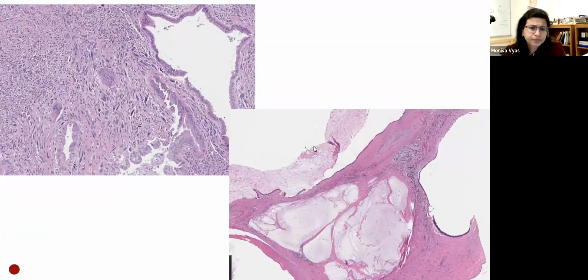And here's a histologic example of the same case which we saw on biopsy before. So this is a ductal adenocarcinoma with a component of undifferentiated carcinoma with osteoclast-like giant cells. So you have a component of tumor which is very poorly differentiated, with sheets of small malignant appearing cells. Some of them also look spindled here between the glands and the undifferentiated component.